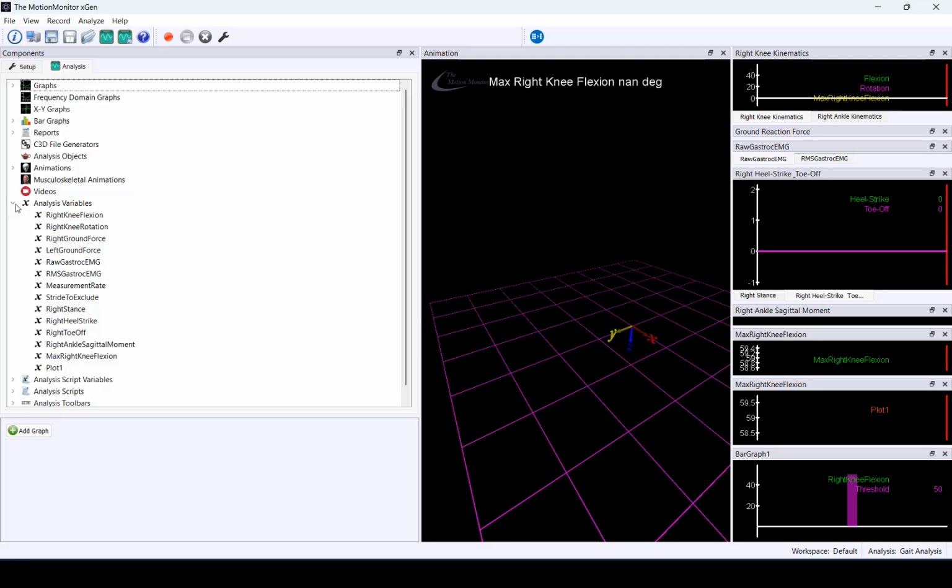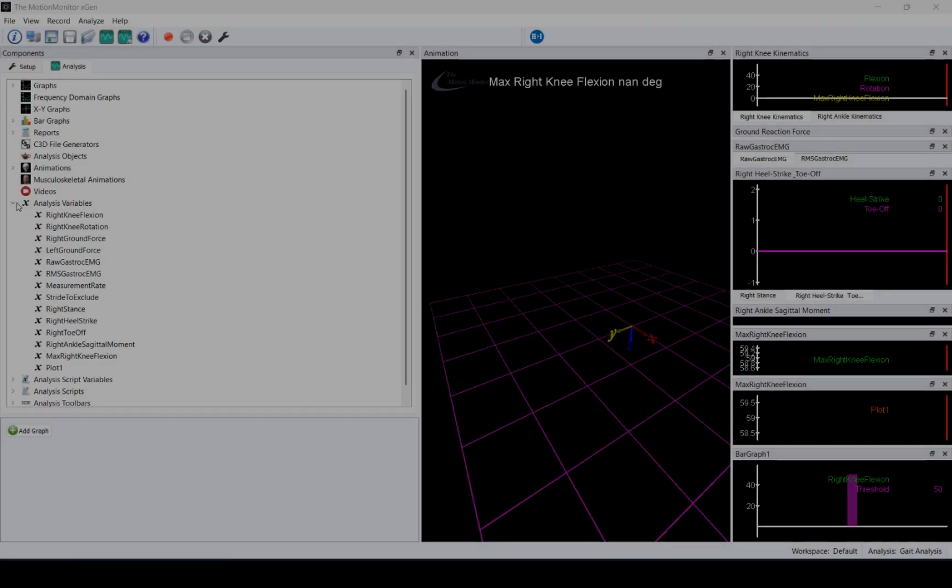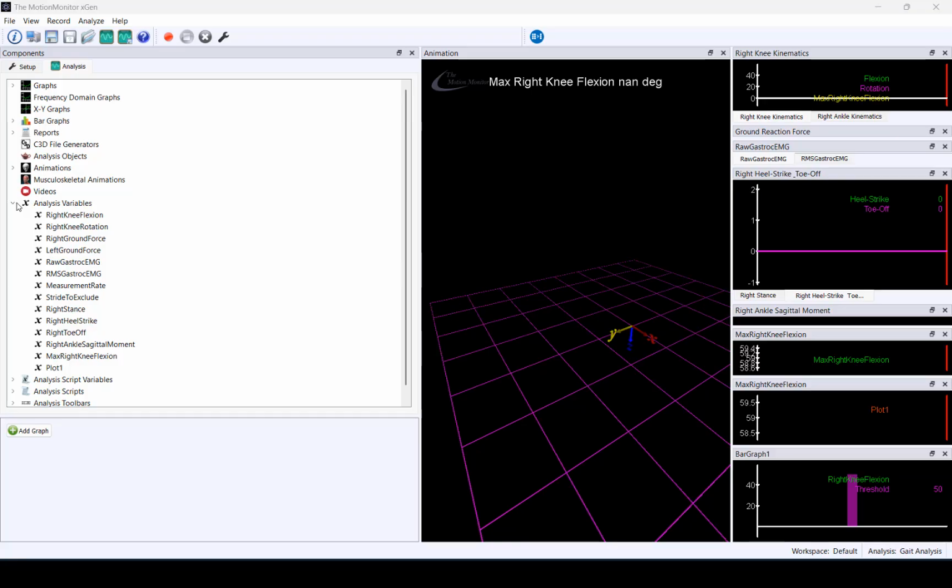This will look just a little different from the activity file because no data has been collected yet. Some users find it helpful to create a separate workspace for data collection and batch processing. Previously, when we were in the Gait activity, we generated a report for that single activity and we just applied an analysis to a single workspace.